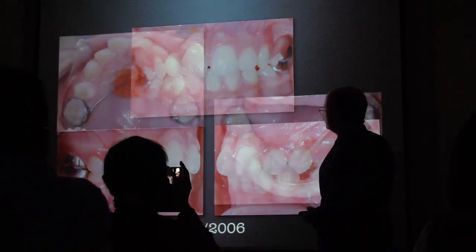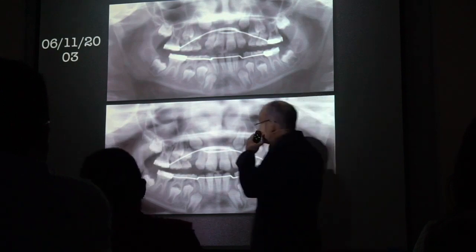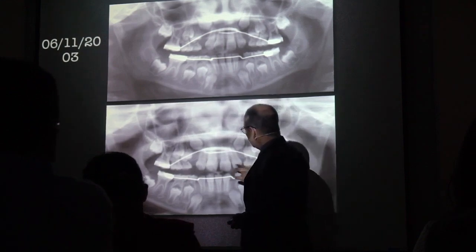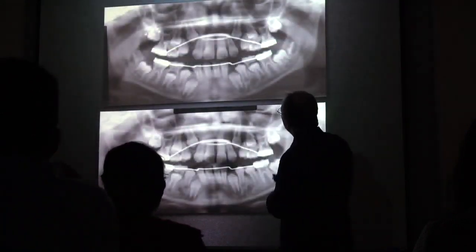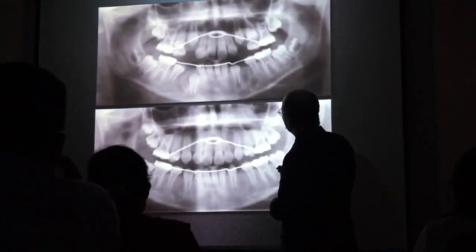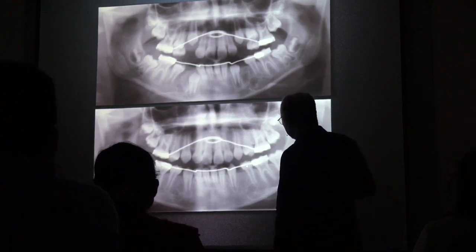This is before the headgear. Sometimes I don't like to use the headgear too much with braces, with brackets, but sometimes I do. This is the moment we decided to wait for this premolar. This is the moment we extract the upper ones. Now I don't have the 4 premolars, but I have anchorage. And this is the moment they came into the mouth.